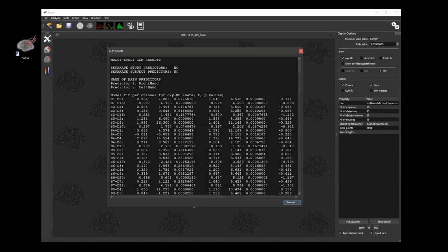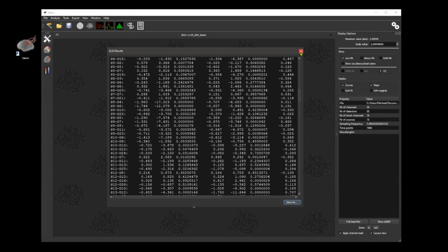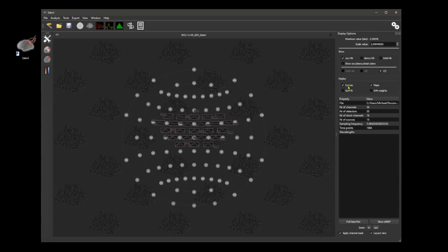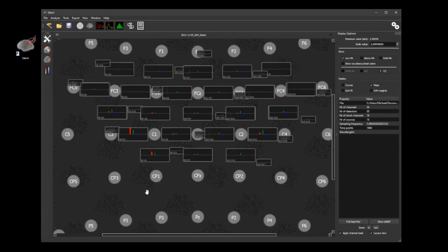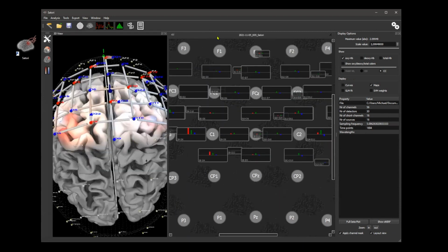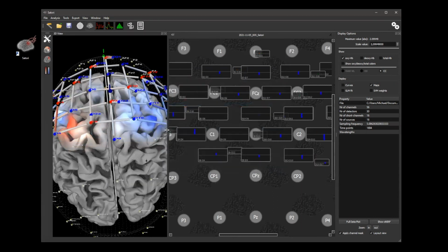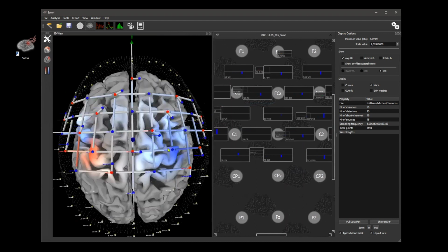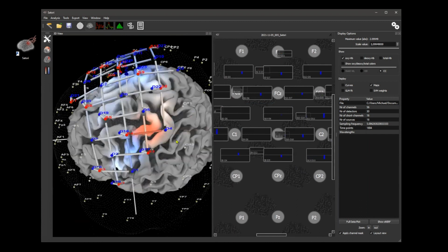As an output, you get the text file of the GLM results. This is really the whole content, but we can look at this also later because it is automatically stored in a text file. But let's look at the data itself. You've seen the pattern before, but now we even see it just overlaying the right one. So now we have the right and left, and we can see that this pattern is now much stronger, and we have much more confidence in the results in the data that we were looking at.